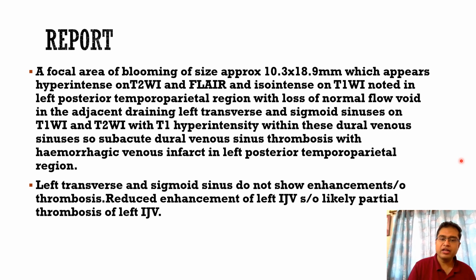The left transverse and the sigmoid sinus do not show any enhancement suggestive of thrombosis, and there was reduced enhancement of the left IJV, likely suggesting partial thrombosis on the MR venography images.